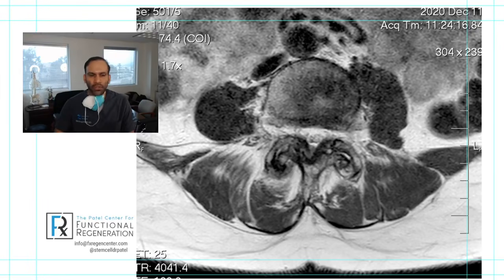These MRIs that we're looking at are all over the place. Some of them have been 1.2, 1.5, and I believe this one is 3 Tesla here. So in this picture, we want to look at those facet joints again. Michael said, "Shame, my 3 Tesla is very blurry still." So on a side note, why does your image get blurry?